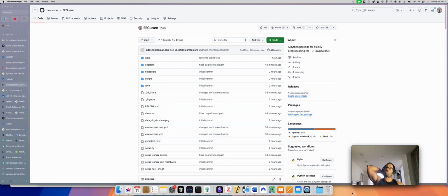So basically, if you start off with a CSV where the columns are channels and the rows are the time steps, you can make it work. But depending on the number of channels and stuff, you may run into some problems. That should be fixable because I've hard coded that everything's 26 channels based on this dataset. Changing that should not be a huge lift, but you would have to do a bit of work. I haven't done that yet.